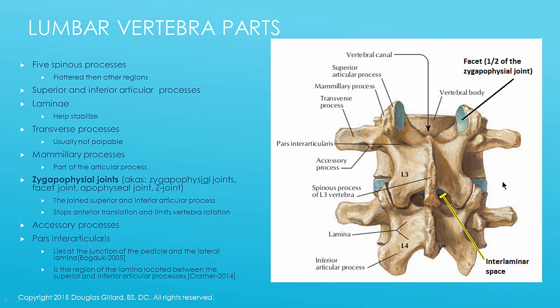So now this is important here. You've got to know all these nooks and crannies of these bones. This is what your test is going to be like. So this is a what? Vertebra, disc, vertebra. So this is a motion segment. Specifically, it's the L3/4 motion segment.